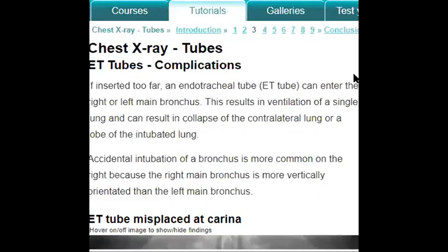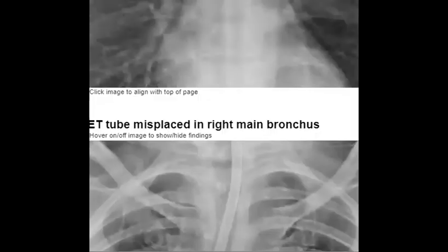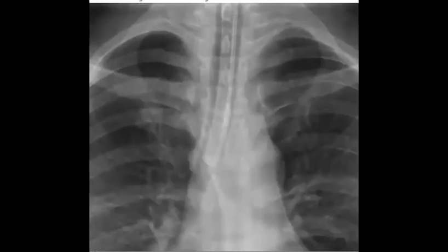I will go through the lines quickly, just to know that everyone is following. So do you like this appearance? If you don't like it, what happened here? No. No, why?